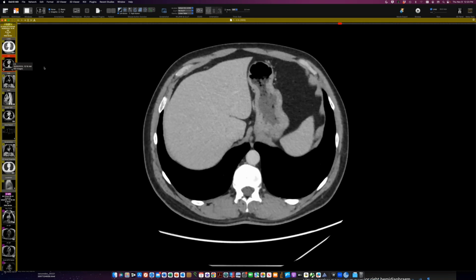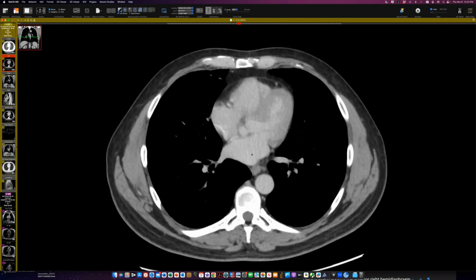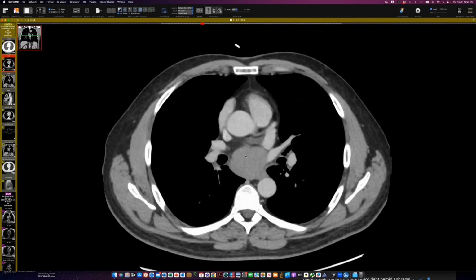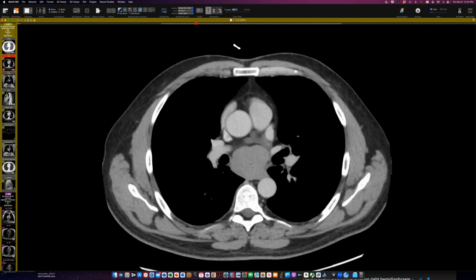So this person has really just a classic set of findings here for a very nice bronchogenic cyst. So slightly high attenuation in this subcarinal lesion here, which is kind of leaning on the top of the left atrium a little bit, and so forth. And this thing had gotten slightly larger over the course of the last year and a half or 2 years. It has slightly higher attenuation than muscle. Down here is like 60 Hounsfield units.